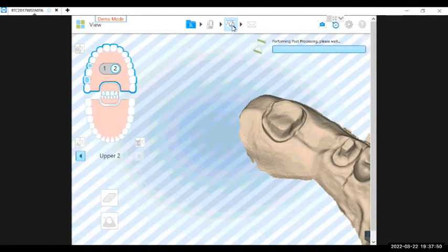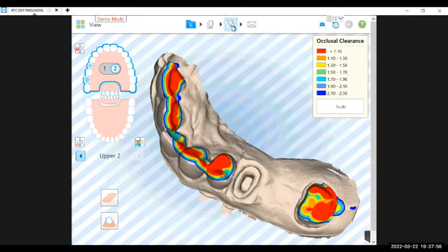And you can too, if maybe you were scanning the prep in color, and then when you finally went to post-processing, you noticed that maybe there was some cord poking out, some fluid, you could use the same eraser tool and just carefully circle the area and clean that up and rescan it. But again, the only thing that would be concerning to risk is the tissue collapsing.